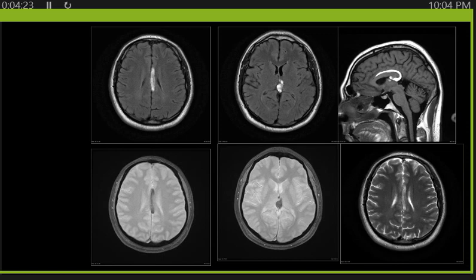What is the difference between them? The thickness of the lipoma. It is about 1 centimeter in the curvilinear and more than 2 centimeters in the tubulonodular type. So tubulonodular is more than 2 centimeters, and curvilinear is less than 1 centimeter.